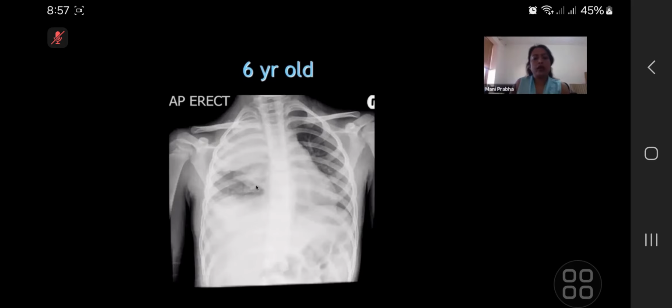Okay, the patient was quite ill. You see that he's restricting his right side, the volume of the right side is less, and he's tilting to the right side, which suggests that the patient is probably pleuritic on the right side. So as you said, there is opacification of the right upper zone, and probably opacification here also, which is the right middle lobe area. The diaphragm is seen, and there is some haziness just above the diaphragm, which can be due to a small amount of pleural effusion.